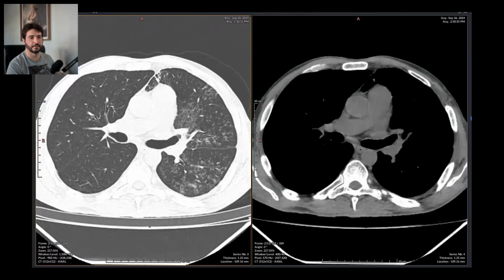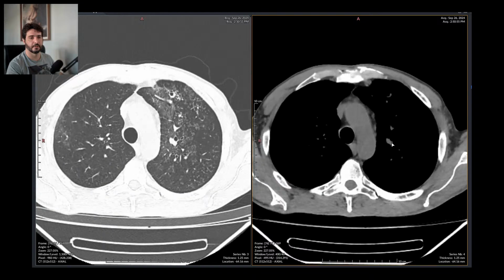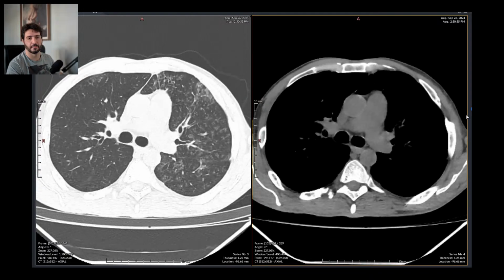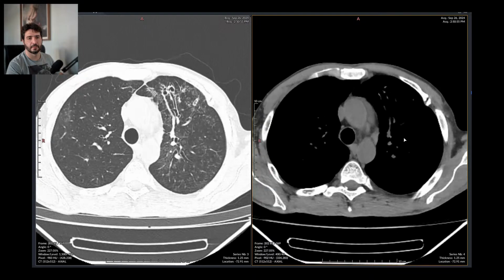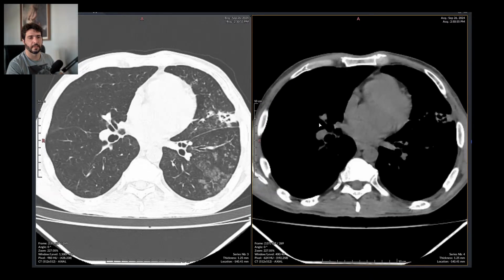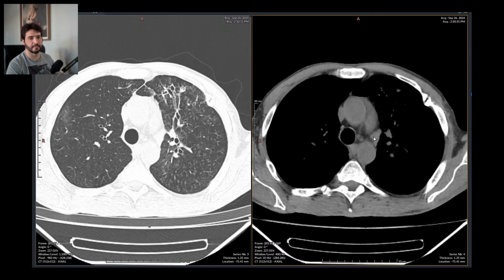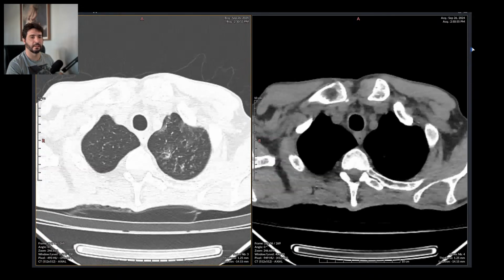There is calcification, residual calcification. There is lymph node enlargement right there on the aortopulmonary window, paratracheal, subcarinal, right there. So we have all we could be expecting from a case of active pulmonary post-primary tuberculosis.